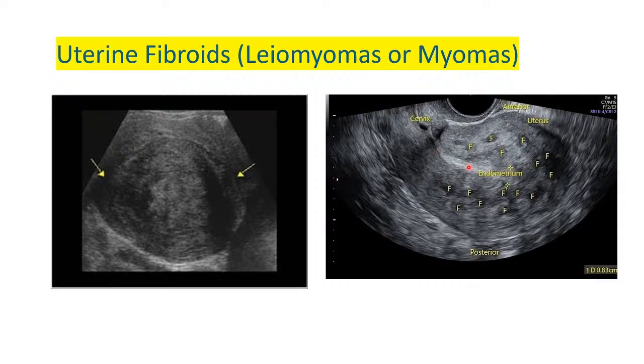And if you look at the endometrium closely, it is very much indistinct. Here it sort of disappears, the endometrium, and then we have these ones. So according to me, this is diffuse adenomyosis. You can have fibroids which are small, but these are not fibroids, but diffuse adenomyosis.